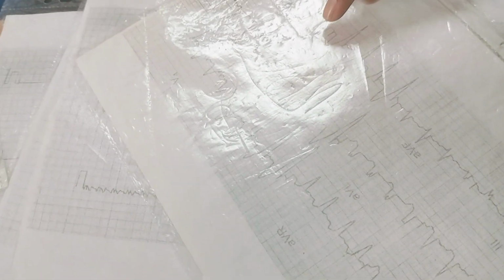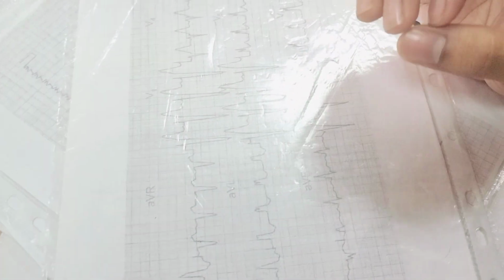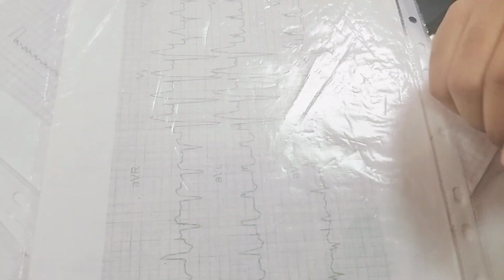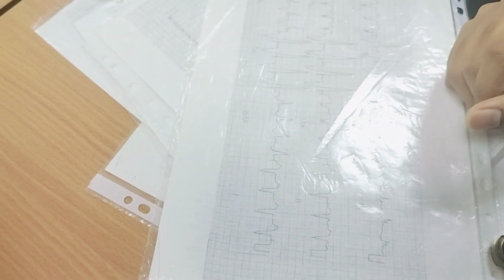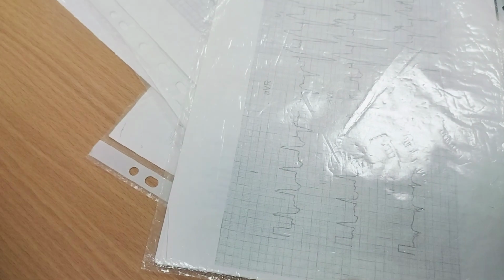But using ECG in cases of, for myocardial infarction first of all. In cases of right or left bundle branch block, it's impossible to find myocardial infarction, to find ischemia, to find some other changes. So that's why differential diagnostics with ECG is impossible.